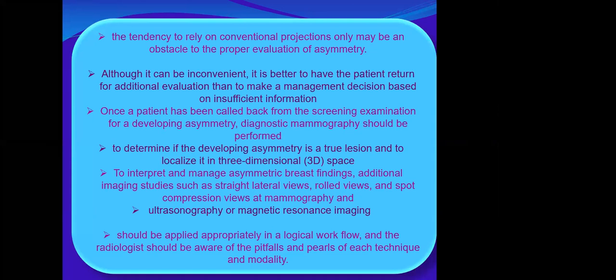Okay, if it seems to be more or less real, we have to proceed and evaluate it further. However, we are saying developing because it is a more concerning asymmetry, concerning lesion. To interpret and manage asymmetric breast findings, we need to use additional mammographic views like compression views and straight lateral and other mammographic views.